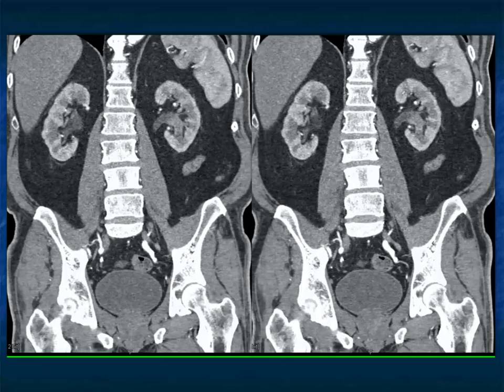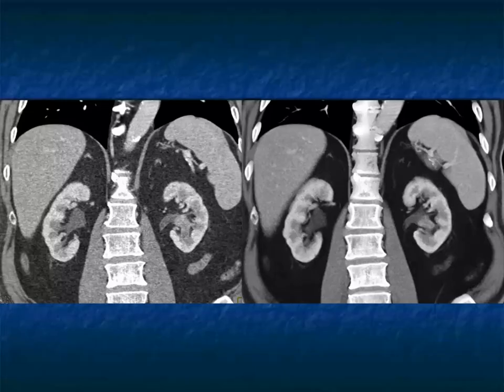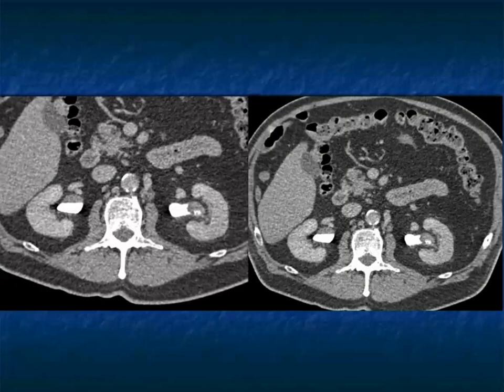You may not see hydronephrosis, but look for increased density. Here it is on the 3D imaging. You see the soft tissue mass tracking to the lower pole calyces. Very nicely shown again on these images. And of course on the excretory phase, which is critical, you can see the mass.